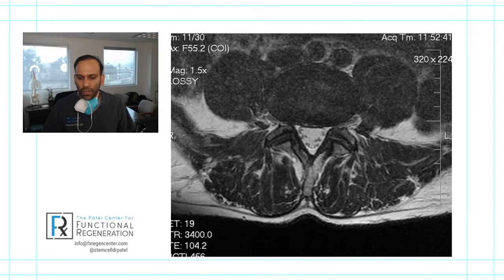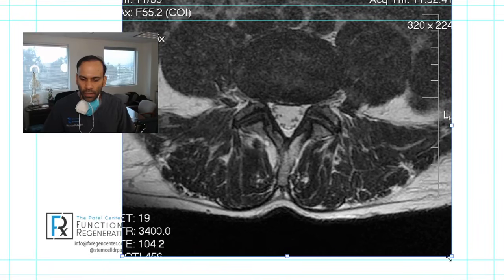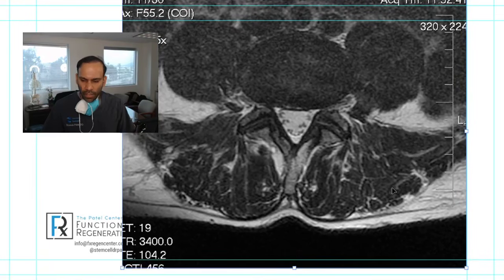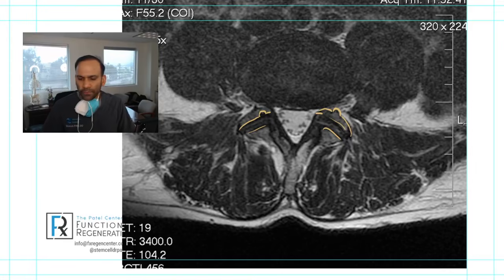So here's another example here. And let's try to zoom this guy in a little bit more. And now we're not only seeing a little bit of increased roughness that's occurring over here, right? But we're also starting to see some changes in the bone itself. Okay, so as the arthritis starts to progress, there's going to be some more abnormality that starts to occur in the bone.